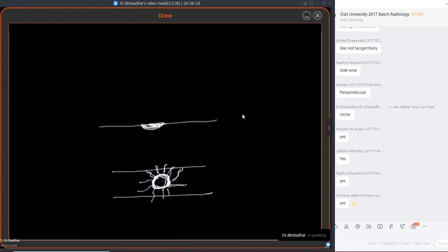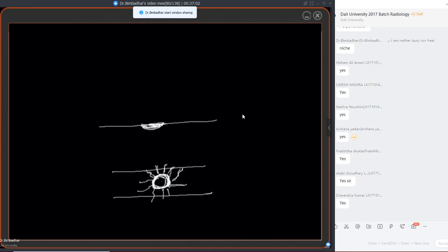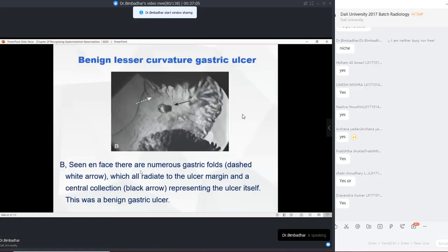If anybody has had wounds, smaller wounds, bigger wounds, yes, right? I think you know exactly what I'm talking about. When you look closer, there are skin folds coming around the area wherever you have a wound. Yes or no? That is also how traction bronchiectasis happens, but that is different. Here, you can see the whole mucosa surrounding the ulcer being pulled.